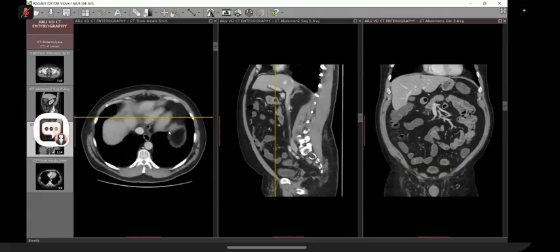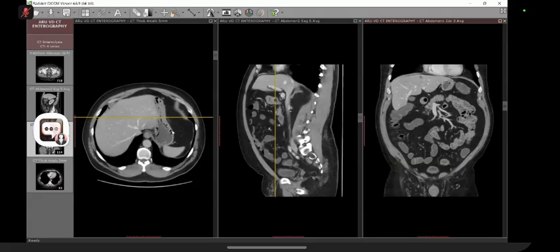Usually, as radiologists, we learn everything on axial. So our axial anatomy is very good. Having said that, please remember that in your territory, which is GI territory, it's critical to go for coronal, and where needed, go for sagittal. And in difficult cases, of course, we see everything, right? But as radiologists, we have to see everything, and we change windows also.